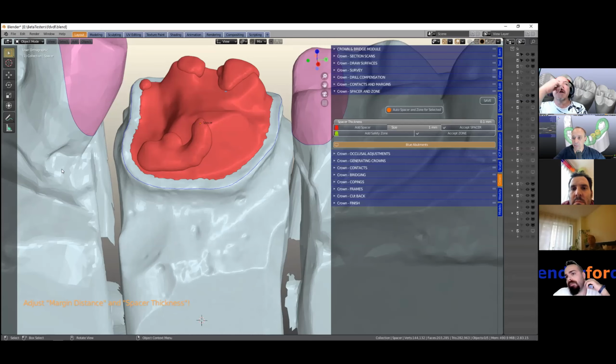I think if we do a scaling factor, we just have to be very cautious about a few things, like inlays or posts, because when we scale it, it's going to go in the opposite direction to where we want to scale it. Do you know what I mean? A cylindrical object is all good because it scales outwards like that. But as soon as you've got an inlay, we have to then scale it inwards.